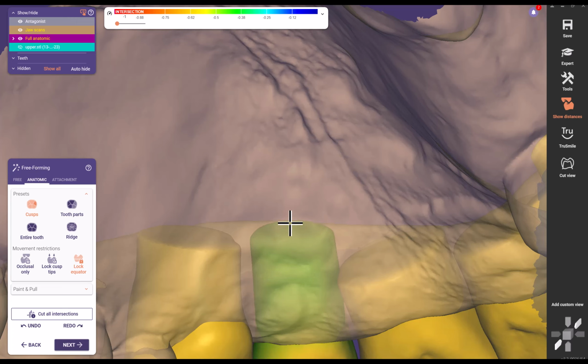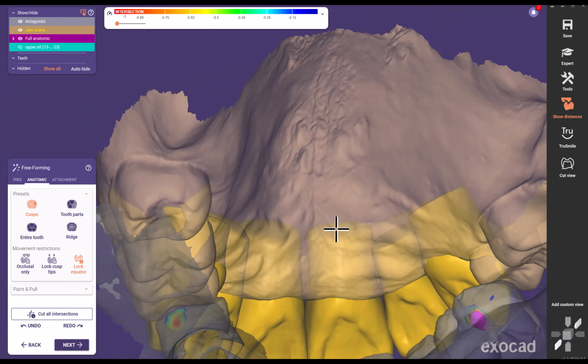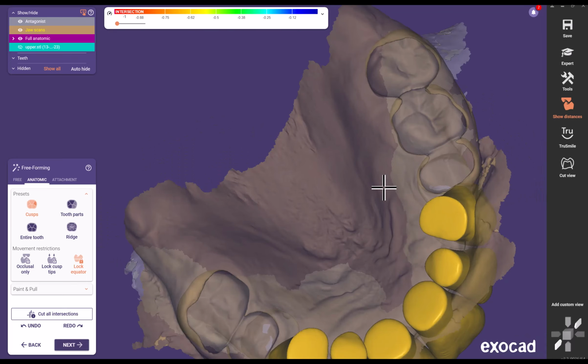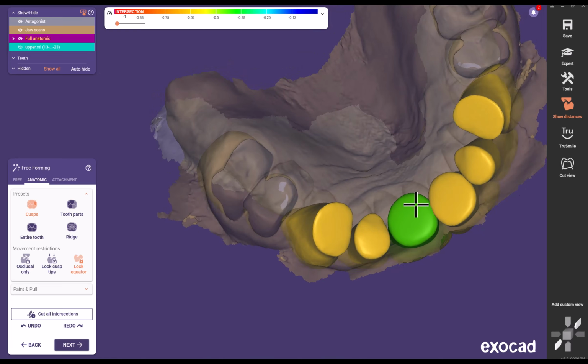Again, there's a lot of questions I'm going to still have, just given the fact that I don't have a facial scan or a full face photo. That is to me one of the absolutely most critical things that we can get. I just don't have it here, so we'll probably have to refine this and redo a few things when we get down there to Mexico and are actually working on this case.